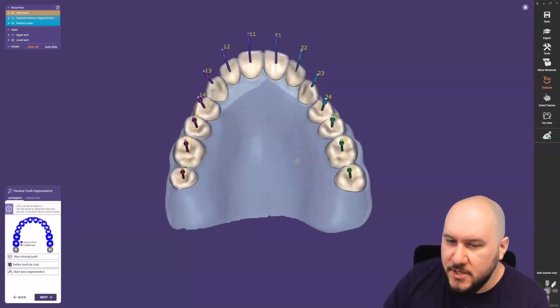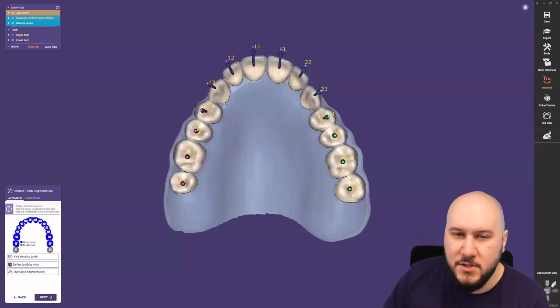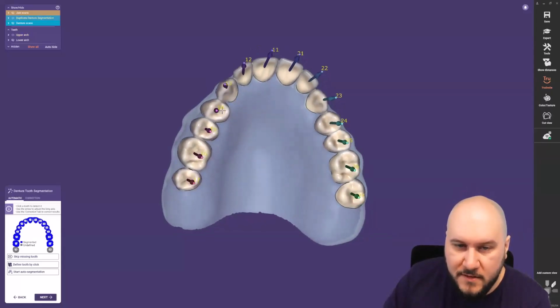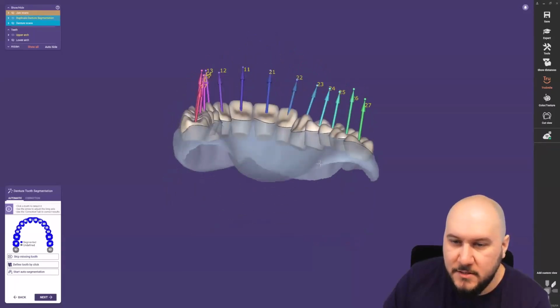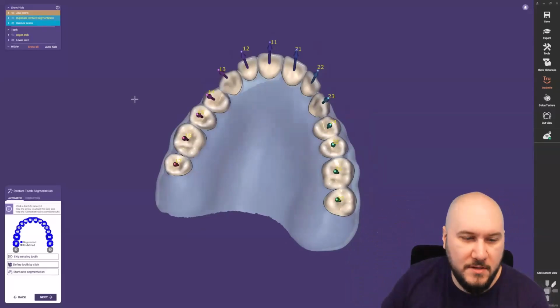The arrows are just giving us a short direction from the top view. This is why they are all separated differently. You can see directly if I check for each arrow that has a different insert direction, and just like that, it gives us the top view of our tooth in this case.